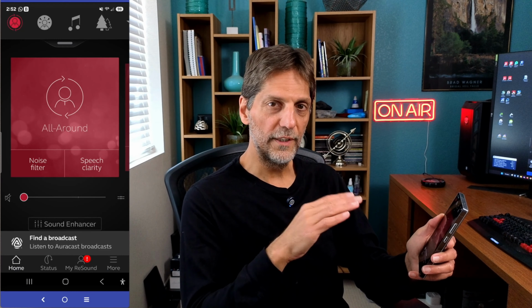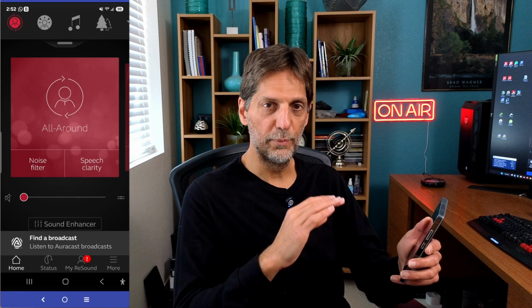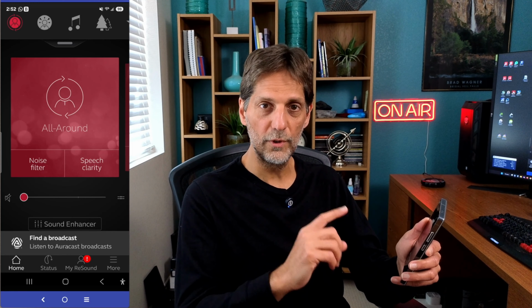Before I move into the other sections, I just want to remind you that the application is coming with a few programs already defined for you. However, don't forget that you can define your own programs as well.